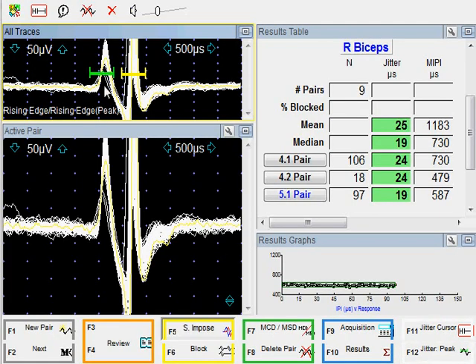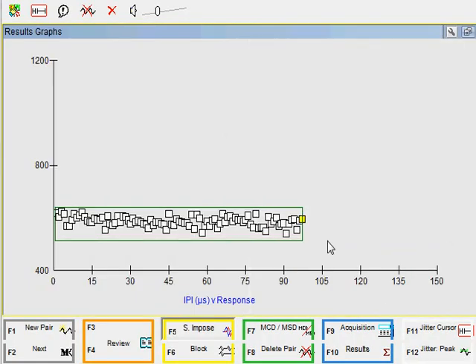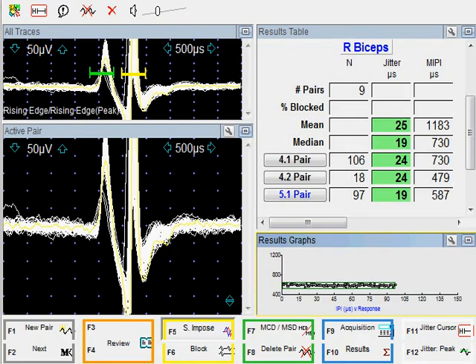And in this case now, the program looks for the level crossing first, and then it finds the peak coming afterwards. And the same thing will happen for the second window. The results are recalculated, and in this instance you notice that these two potentials with small window, rather small amplitude, were not excluded. When we look at the distribution of interpotential intervals, notice that we do not have any short time intervals. And again, this occurred because of peak to detect the interpotential intervals rather than level crossing.